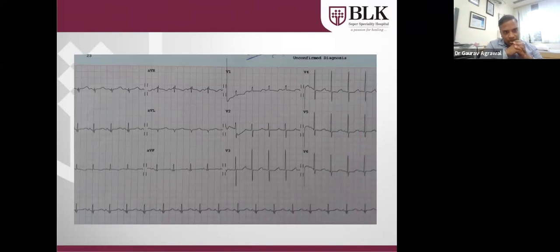Sinus or not sinus? Anyone? Somebody say something.